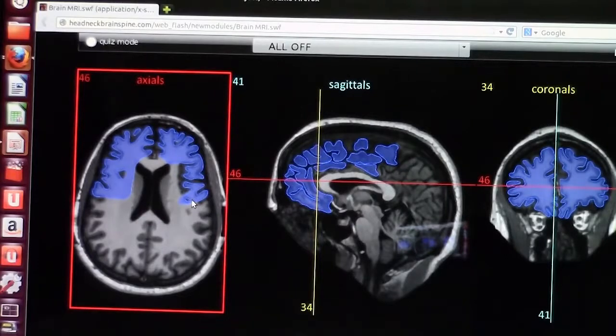Key point, you need to focus on the whole MRI, not just on the brain. It's a given you need to look at the brain and comment on any abnormality. But remember, whatever is shown in the MRI, like the sinuses, the vessels, if any part of the neck is obvious, or the calvarium, you definitely need to look at that and get used to looking at that, as missing it can lead to catastrophic abnormalities.